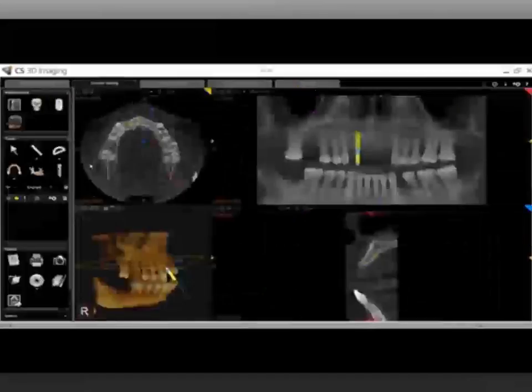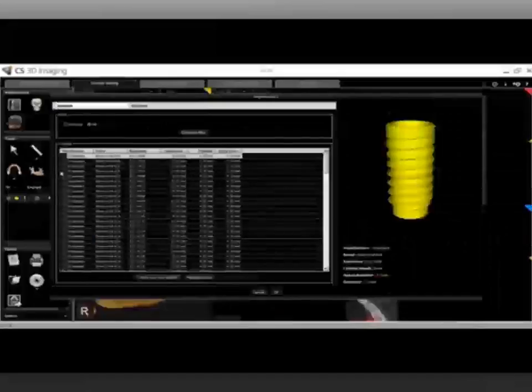To return to implant functionality, we must go back to curved slicing. To access the implant library at any time, just click the Implant Placement tool. Although we downloaded the entire Straumann implant library, there's a very good chance that for whatever manufacturer that you only use a handful of their different implants.